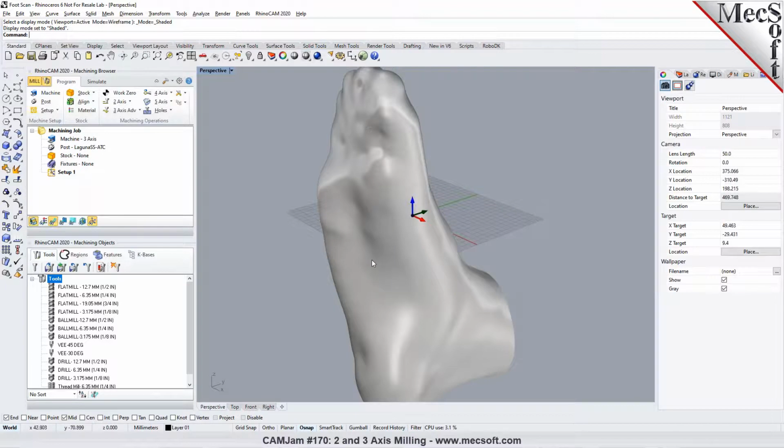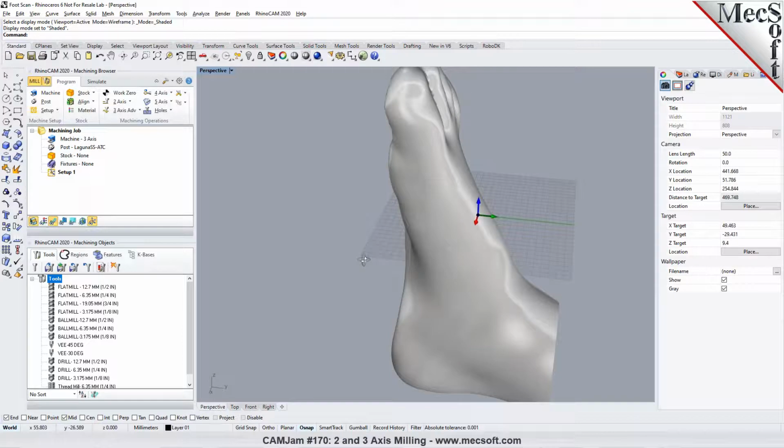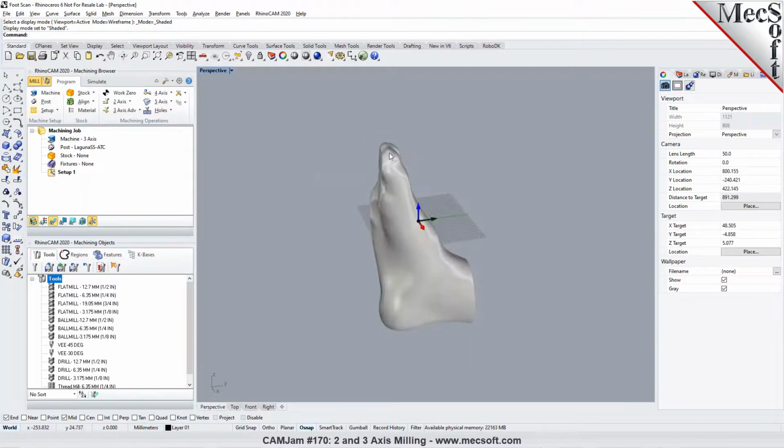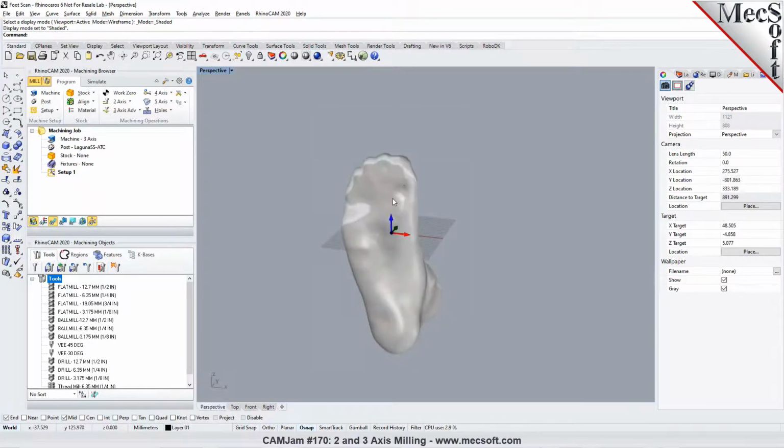Right. But we obviously need it to be, at least up to kind of the ankle. Okay. Yep. So which means you will need to bring in the scan the way it is. Do you just need to do the inside portion, or do you want to machine this side from this side? No, from that side, yeah. Where my cursor is, that correct? Yes. Okay.